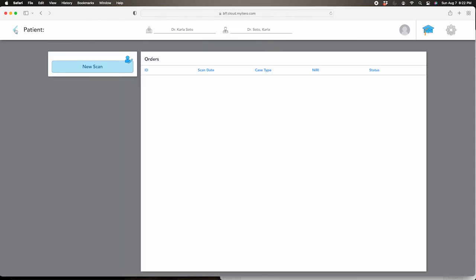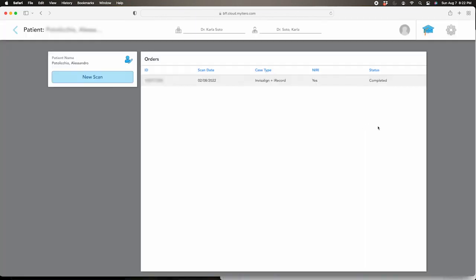And that takes you straight to the simulation. So don't think that you have to go to the viewer and then the other way. That takes you straight to the simulation with all of the same tools and all the same buttons.